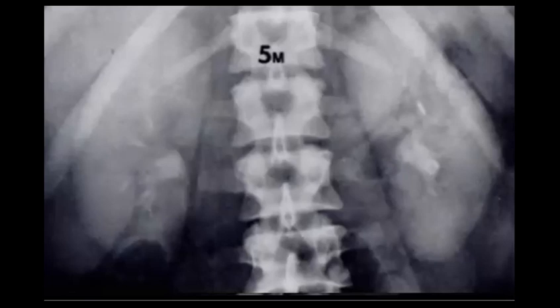And what is the abnormality here? Okay. So persistent nephrogram, perfect. So this one is what is called persistent nephrogram. So what is the differential when you find bilateral persistent nephrogram? Yeah, differential diagnosis, whether it is bilateral or unilateral. So in this case, it is bilateral, as you see. So yeah, what is your differential? Contrast reaction, maybe. Nice.